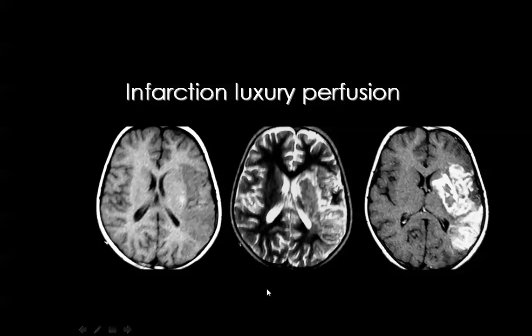Then if you inject the patient who is suspected to have an infarction with contrast media, the infarction leads to disturbance of the blood-brain barrier, and there will be an enhancement which is known as luxury perfusion or gyral pattern of enhancement. Look at this example.